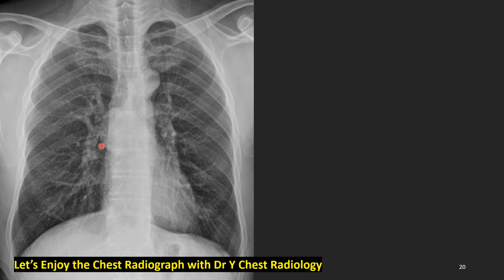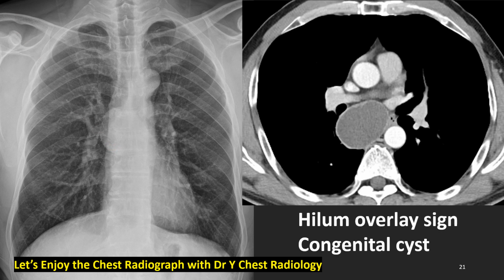You can imagine where this tumor is. On this axial contrast enhanced CAT scan, we see the 4 cm well-defined homogeneous cyst here, subcarinal area, normal right pulmonary hilum not in contact with the cyst, and right paravertebral stripe also not in contact with the mass. This is visceral compartment congenital cyst, most probably a bronchogenic cyst.